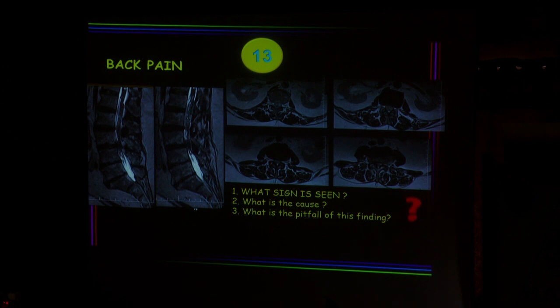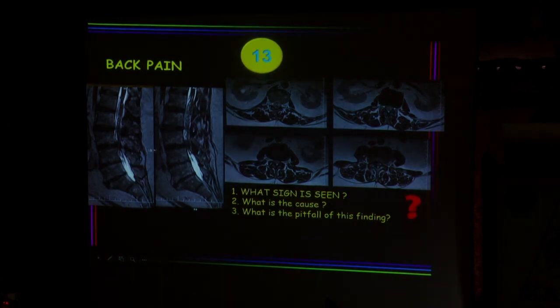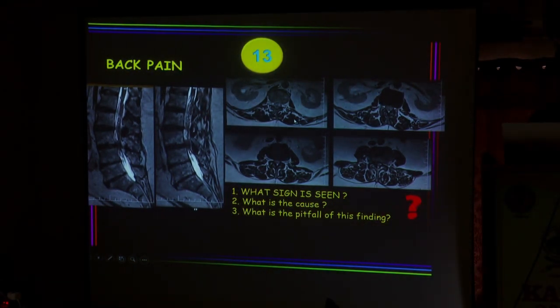Patient with back pain, what is this sign? What is the cause? What is the pitfall of this finding? This is of very great practical importance that you have to know to identify. So anybody knows what is this sign? So what is the cause for this? If you know the sign, you know the cause. Okay, anybody knows what would be the diagnosis? Loudly.